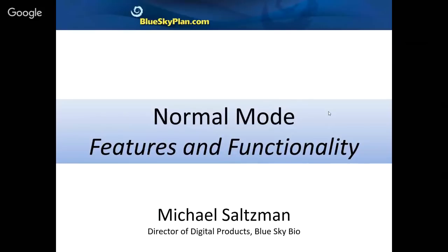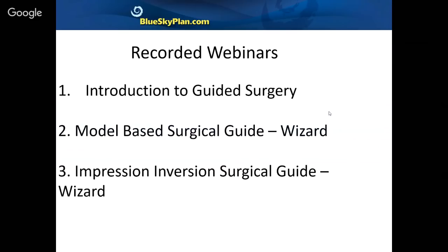The topic of today's webinar presentation is the normal mode in the Blue Sky Plan software, features, and functionality. This is the fourth presentation of the webinar series. The first three covered the topics of introduction to guided surgery. It described the basic software layout, how to import and bring into the software the different surfaces, the different data sets, and basic topics of CT scans and CBCT scans.